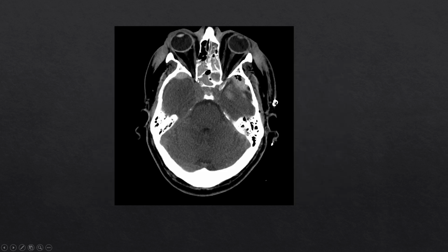Here we have a case of bilateral biconvex, hyperattenuating extraaxial collections, which would be consistent with epidural hemorrhages.